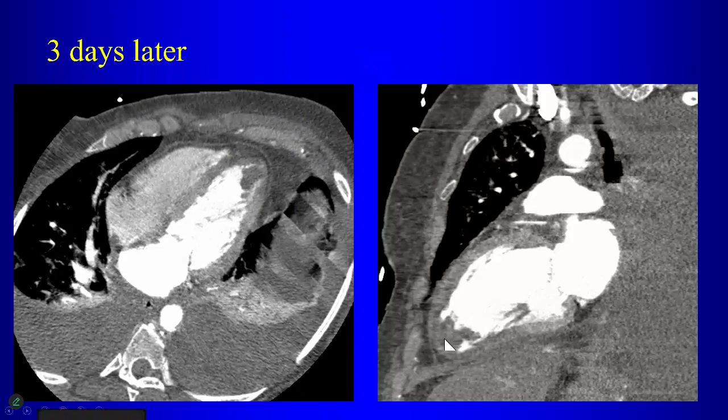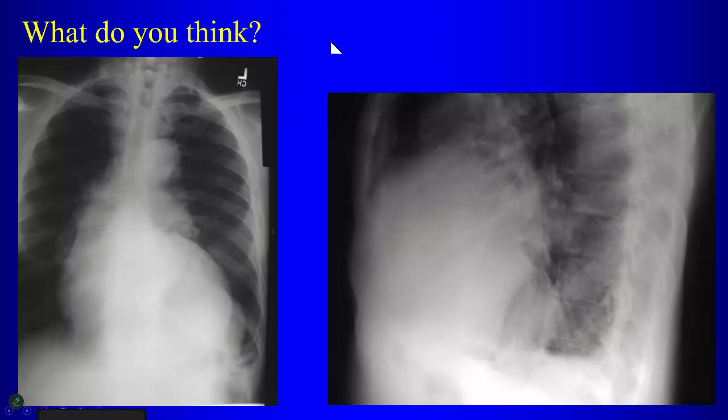It's very common, even in patients after they've had acute infarctions, because of wall motion abnormalities. So a complication of this is also for patients to develop thrombi, intracavitary thrombi. So this is a thrombus here at the apex of the ventricle. And again, you can kind of appreciate the decreased perfusion along the myocardium there, okay? Okay, so if I tell you that this patient also has a history of myocardial infarction, what's peculiar about the chest radiograph here?